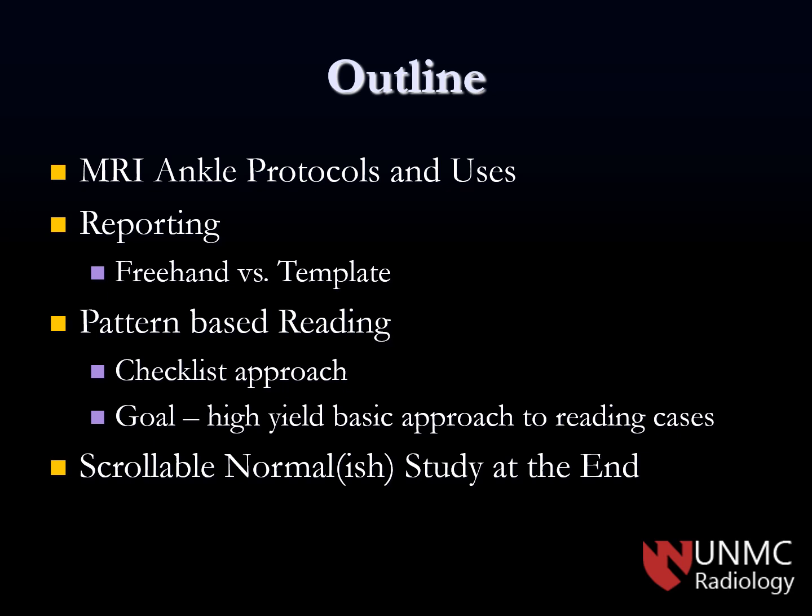The goal is just to give you a high yield basic approach to reading cases and to be more comfortable reading ankle MRI. There are scrollable, normalish images throughout this, and then at the end I put all the images together, so if you use this PowerPoint at a later date, you'd be able to scroll on those images and go over the anatomy yourself.